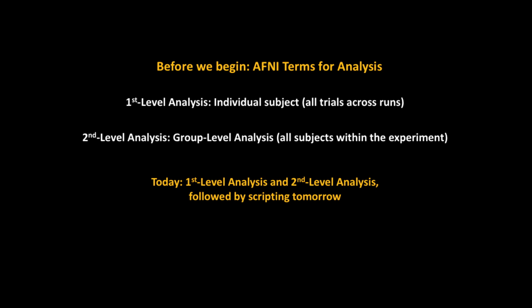I'm using parameter estimate and beta weights somewhat interchangeably. Whether one's superior or not, I can't really say. But with AFNI, you can get more into what FSL is trying to do by using something called 3dMEMA, which is a mixed effects model which takes into account variability within the runs.